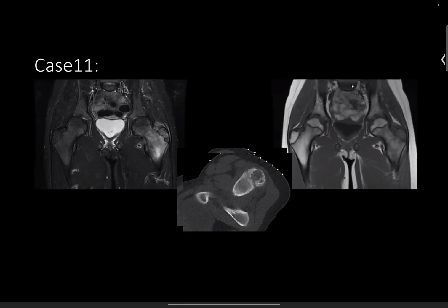This is a very thought-provoking case. I like to show this case here, where you need to say where is the lesion and get your differential. So I see people are already getting it. We have a lesion in the greater trochanter. So first to realize there's a lesion in the greater trochanter with massive surrounding edema. So you have a lesion that's in an apophysis, which is an epiphyseal equivalent. And we talked about epiphyseal equivalents being the same as the epiphysis. We go to the CAT scan, we see little tiny punctate calcifications. This is chondroblastoma. You guys are awesome.